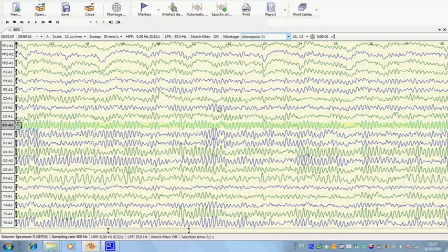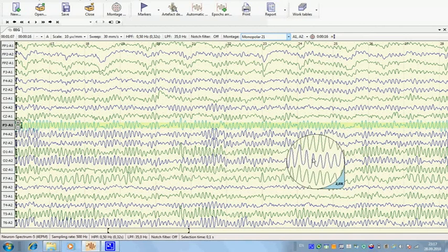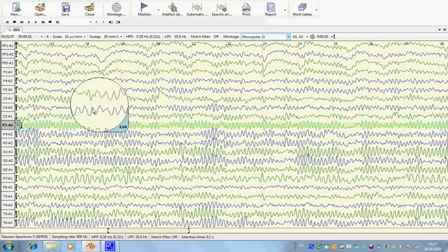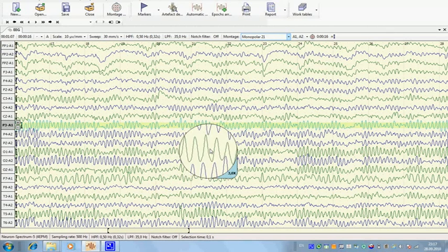Also, you can use the zoom tool. Press and hold the Ctrl and Alt buttons of your keyboard and move your mouse. Using the mouse wheel, you can change zoom scale.